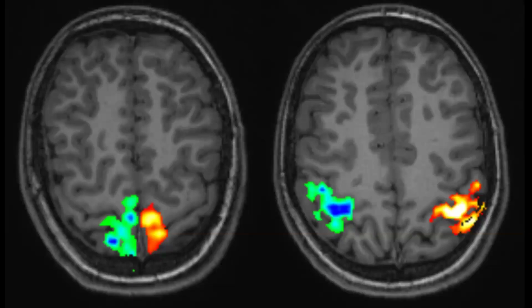Here's an example of MRI images of a patient, and this patient is performing a motor task. This patient is wiggling his toes, and what do we see on the fMRI images? We see that there's an increased signal in the paracentral lobule, which contains the primary motor and somatosensory cortex of the feet and legs.